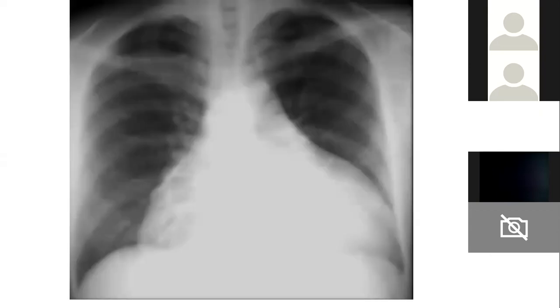Now what can this be? Based on this chest X-ray, what is the abnormality?